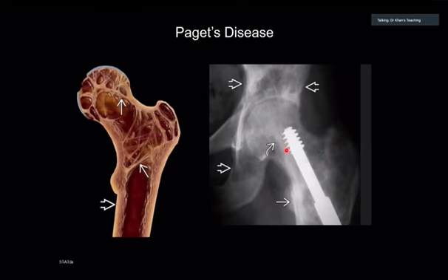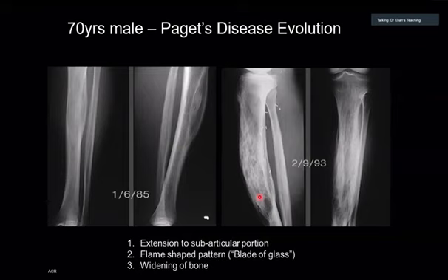Thickening of the trabeculae is something you have to develop your eyes for in the exam. Look at this case and how Paget's disease has progressed from the lytic phase into the mixed phase, and now there is coarsened trabeculae as well as bowing of the bone.